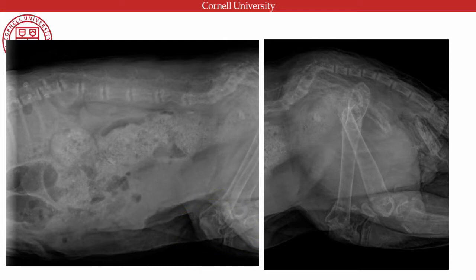Otherwise, she has historically been eating, and does have ingesta in her colon. Serosal detail is appropriate for a young cat. We can see a little bit of the renal margin here, so we can see the cranial pole of the left kidney there. And we are seeing some fairly active ingesta going on. But big problem with the skeletal system.